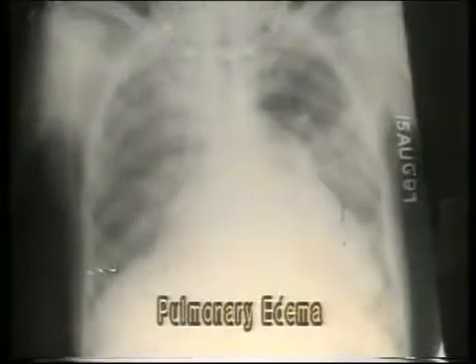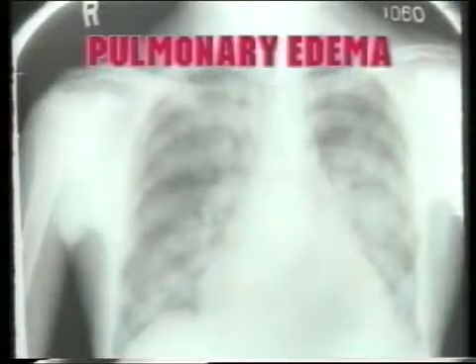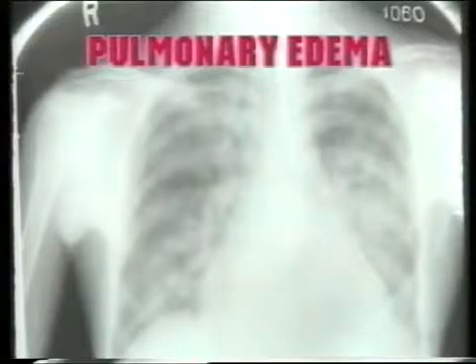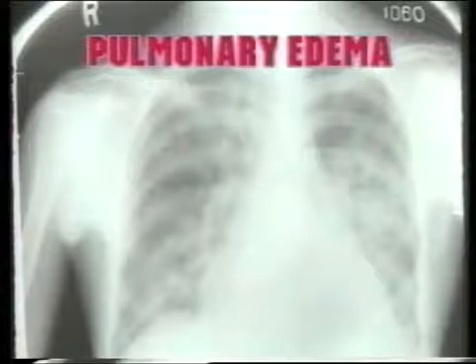This is another X-ray showing cardiomegaly and an early bat wing appearance. Note the mid-zone consolidation on both sides plus upper zone involvement on the right side. This is pulmonary edema and a mitral heart. This is another set of two X-rays. In the first X-ray, note the cardiomegaly with patchy consolidation in the mid and lower fields. And the second X-ray, after 1 week, shows complete clearance of the lung fields. This rapid vanishing of the consolidation with diuretic therapy is another characteristic feature that reconfirms the diagnosis of pulmonary edema.